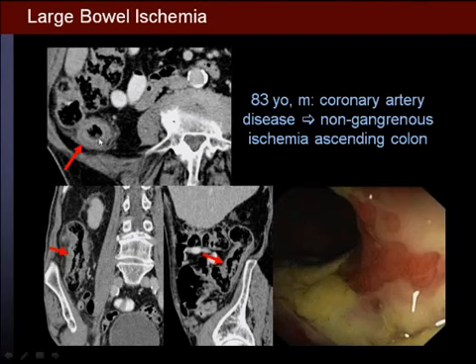We have the hypodense submucosa, and we have somehow a hyperdense outer layer indicating blood or contrast agent, but there is no gas, it's just a thickening, and this is the same pathology shown in the coronal and sagittal view, and we can recognize there's obviously some bleeding, but there is no transmural necrosis in this patient, and he recovered after a few days.